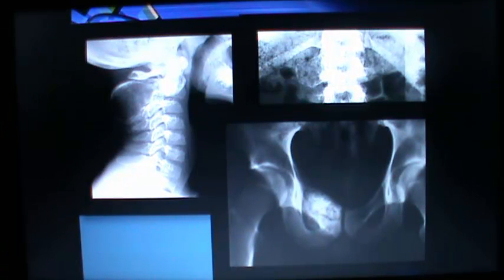Here is an osteoblastoma which has had time to grow with minimal periosteal reaction, with minimal bone reaction around. It results in expanding lesions in the pedicle or in the spine, and can even occur in the pubic ramus. But as we said, the main lesions are seen in the humerus and in the vertebrae.